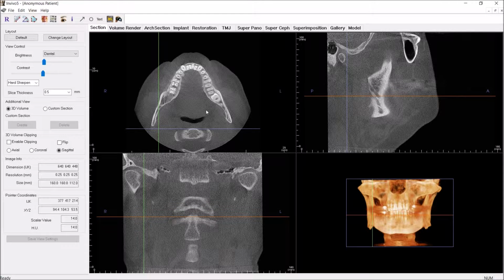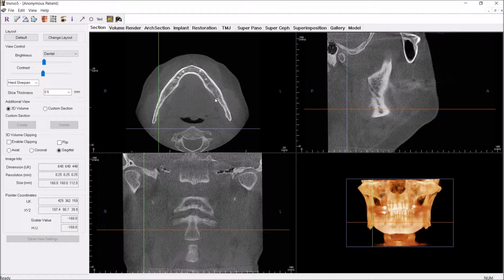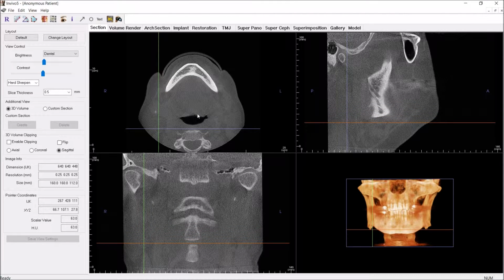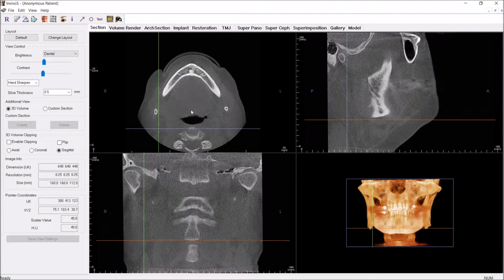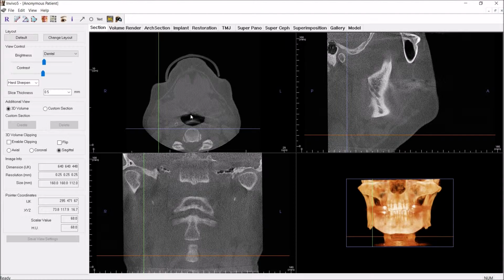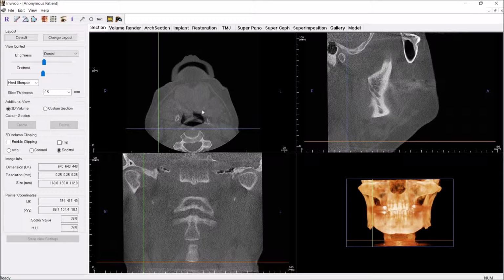So we keep scrolling through. Again, I'm looking at the middle portion of the axial plane. Here we can follow the inferior alveolar canal as it goes past this wisdom tooth. I'm looking in here. Maybe I think I see something. I go back. Okay, go further down. We can start to see the epiglottis, but the airway is patent and looks pretty normal.